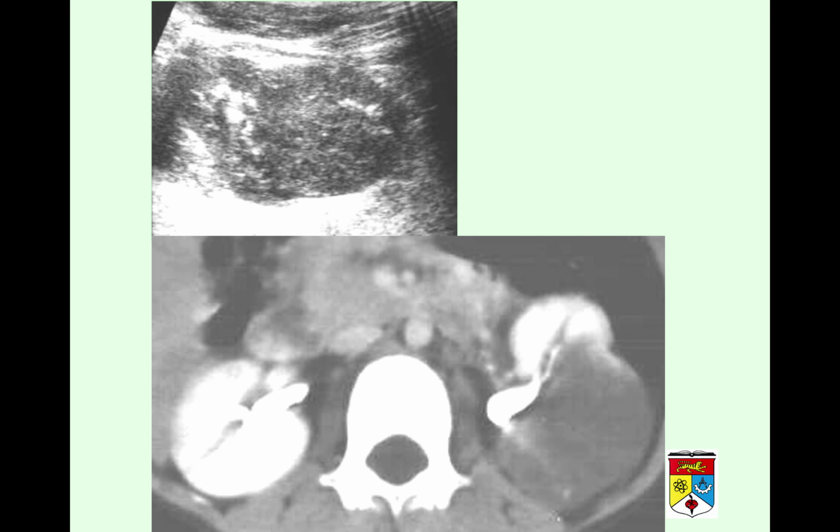Now again, abdominal mass. So what's the imaging modality of choice? Ultrasound. In this case we did an ultrasound and we saw it is not fluid, not black like just now, but instead it looks like soft tissue, slightly bright, in a kidney. This is the left kidney, because you see this is the kidney and that's the renal sinus, but the renal sinus and parenchyma at the inferior part is being disturbed by this mass. You see that the mass is rising, so this is what we call the claw sign. Okay, the claw sign, like a claw.